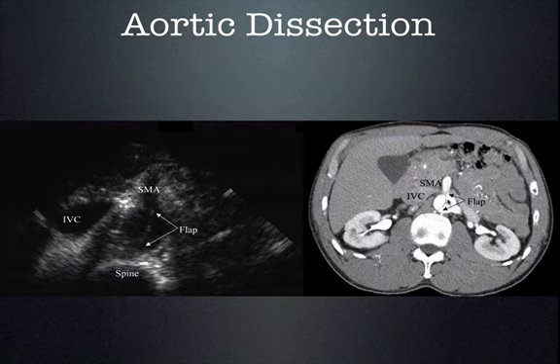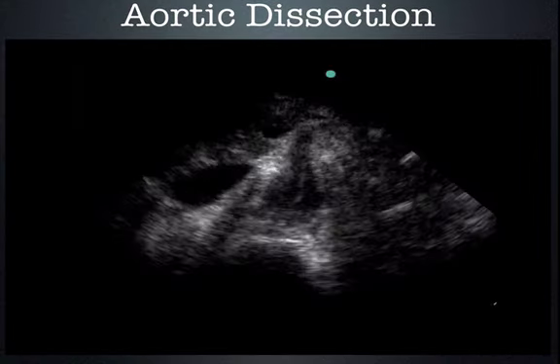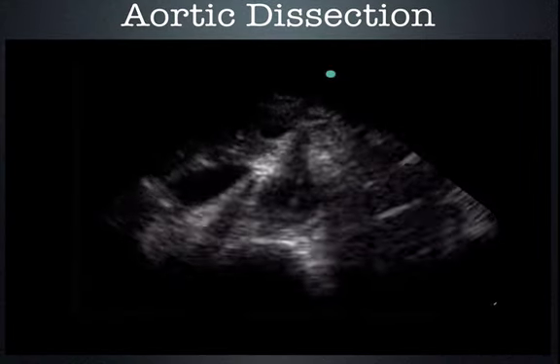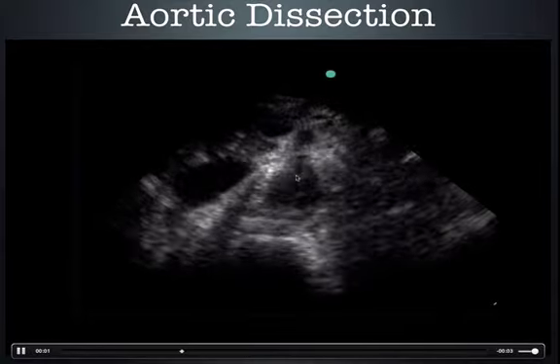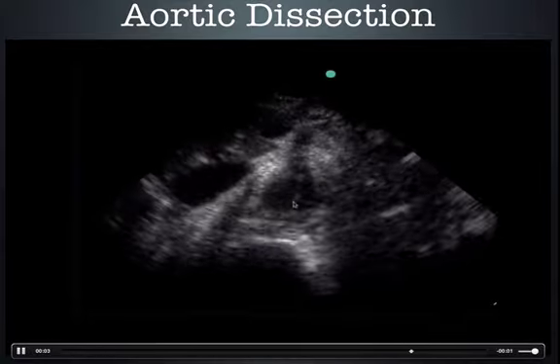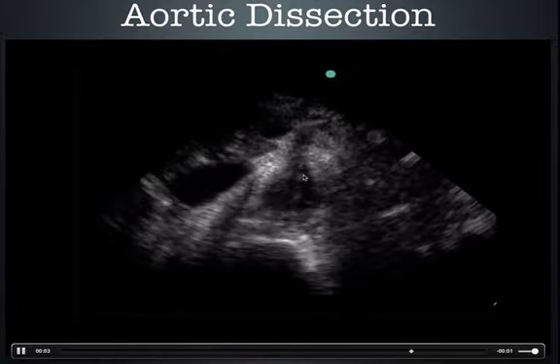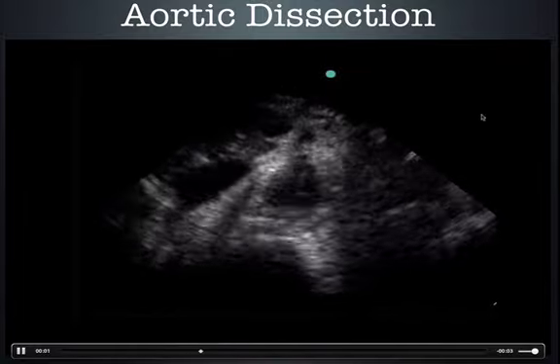Now here's the corresponding CAT scan image for the same patient. You can see this aortic dissection here. Now here is the same patient with the video clip. With each beat, there is an oscillation of that intimal flap as the blood rushes by. And you can see actually this intimal flap is dissecting up into the superior mesenteric artery.